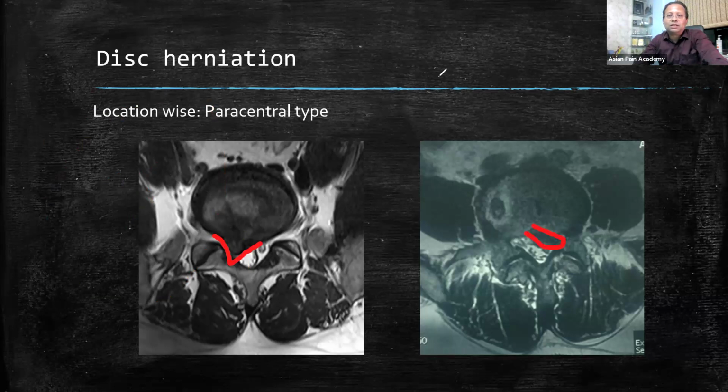Here one more thing you see. Here at this area, this consistency and this consistency color wise is same. Color hue is same. That means what? It is at the level of the disc. Okay, but is it same? This color and this color it is not same. Means this is the vertebra, and you can see pedicle connection also. But still you see the black disc. That means what? The above level or rarely lower level also, disc came out and migrated. Okay, so this is migrated disc.